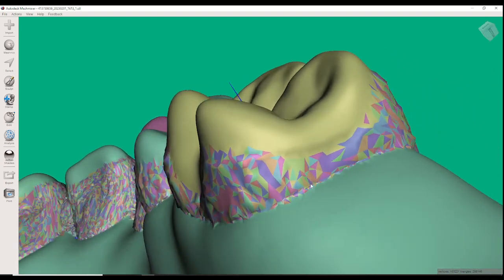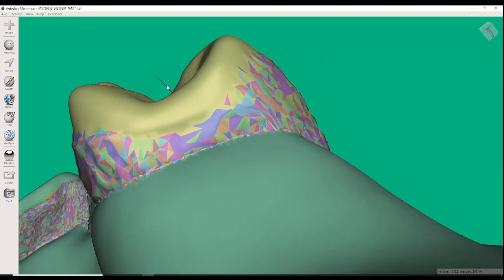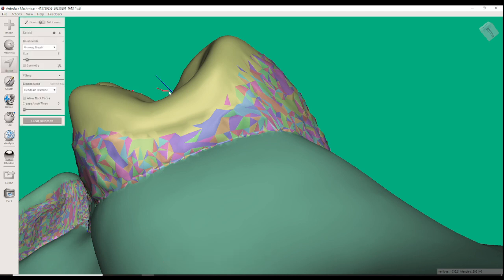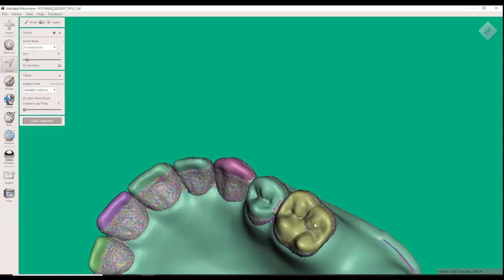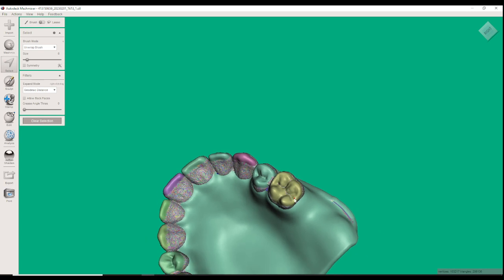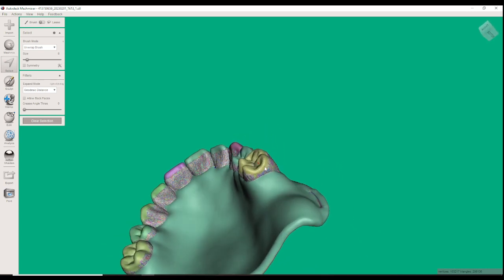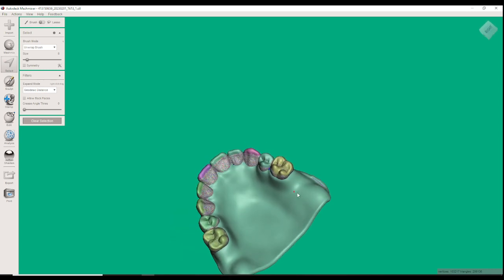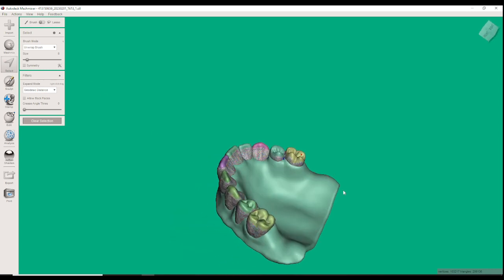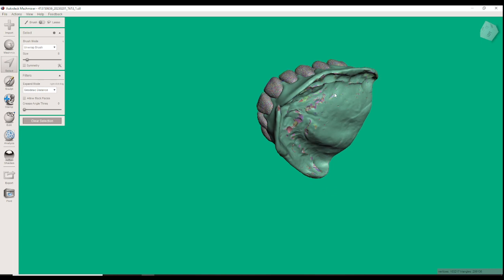Well, I'm going to somehow try to isolate it. See if we can do it this way. And delete it. Yep. So I just selected it this way. When it's this small, sometimes it's really difficult to select it. So I kind of zoomed out and did a selection with the line instead. So now we've cleaned that up.